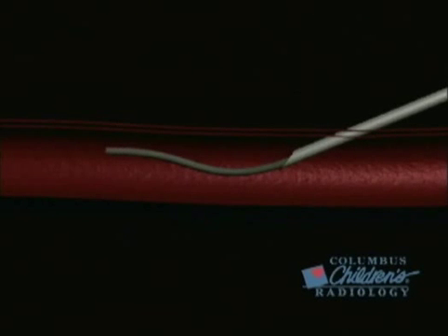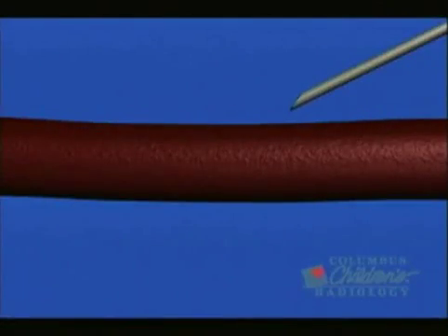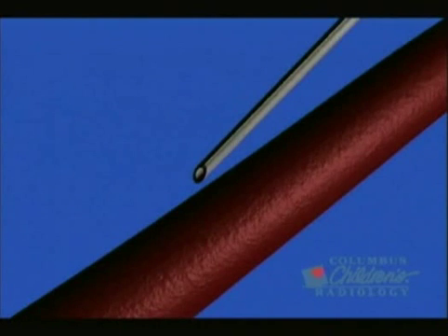In this animation, we see the classic long axis approach or the longitudinal approach, single wall puncture technique with the needle and the guide wire advancing in the vascular lumen. Here we see volume averaging artifact. We approach the needle into the vein and it looks like the needle is in the lumen, but then we look either in the transverse plane or move the transducer in the long axis view to see that we are adjacent to the vascular lumen, not within the vascular lumen.